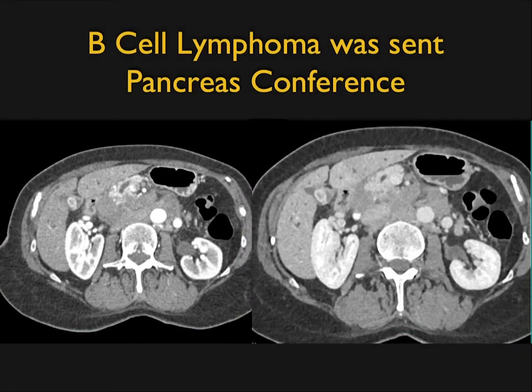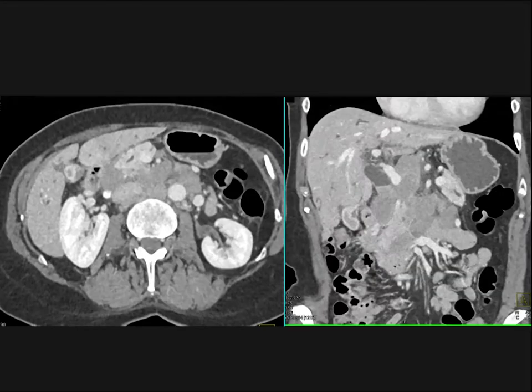Now here's another one. This case was sent for adenocarcinoma. I read this case in Pancreatic Conference. Look how bulky the nodes are. And yes, I've seen nodes. Look at the coronal. I've seen nodes in pancreatic cancer, but that's really rare.